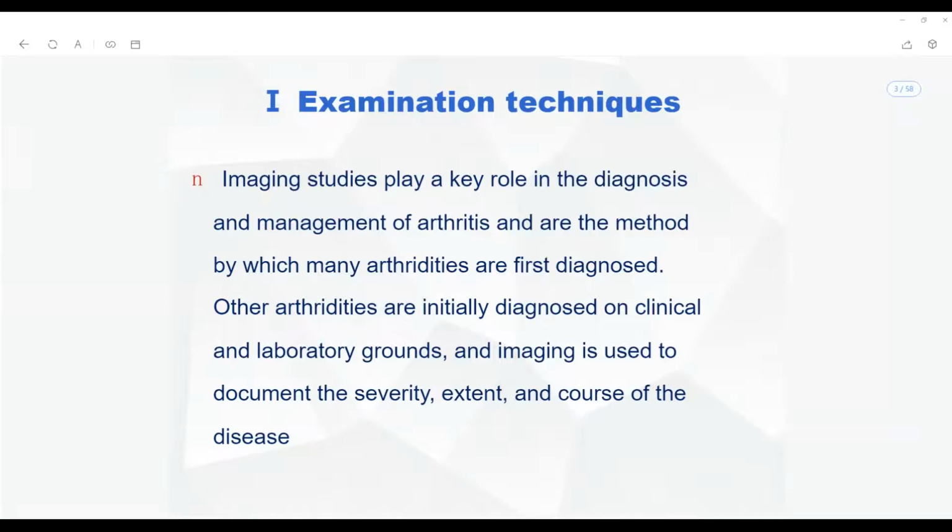You are going to talk about hypersclerotic changes. We are going to see a little bit of osteosclerosis. Osteosclerosis is in the sense that there is an increased density of the bone, but particularly this is not some kind of metabolic bone osteosclerosis-like condition. We are going to look for the abuse of the joint, overuse of the joints. And if there is an overuse of the joints, what technically I am going to find is that only certain parts of the joints, articular surfaces, are going to show osteosclerotic changes, which actually indicates that there has been an abuse.